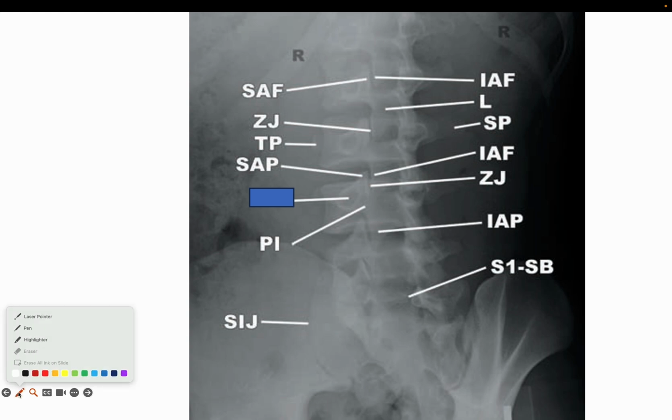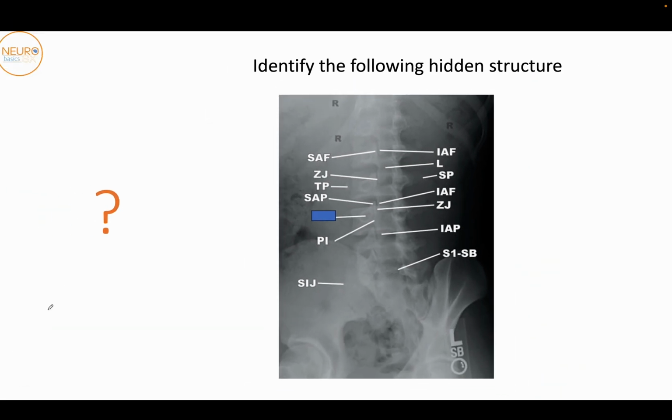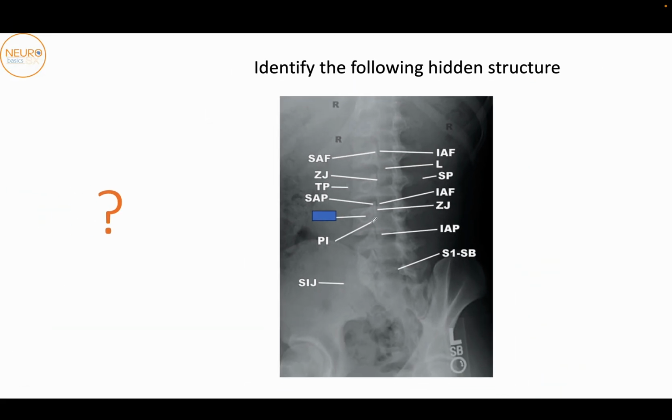Again, let's just draw the dog so there's no confusion. Okay, so this is the dog. It is an oblique view, so it can look slightly confusing.